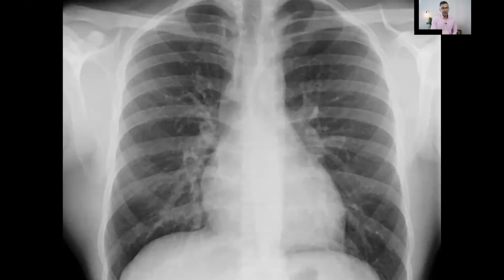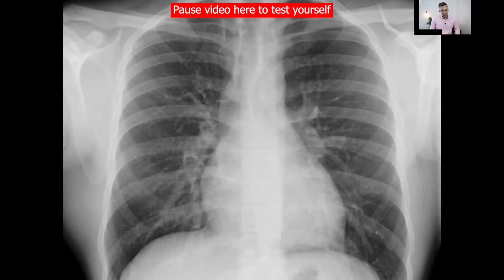Tell me what you can see here. Actually, everyone, just have a go at describing this chest X-ray. This should take 10 seconds. Hopefully, everyone's had a look and seen something abnormal. And again, if this was the situation, young male having shortness of breath, chest pain, Jonathan, what do you see? Read this chest X-ray.